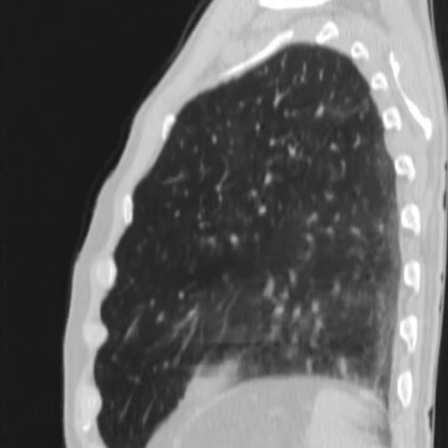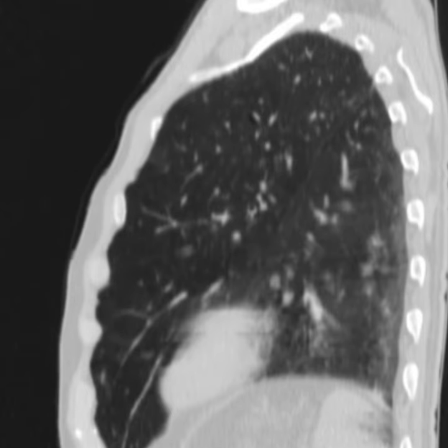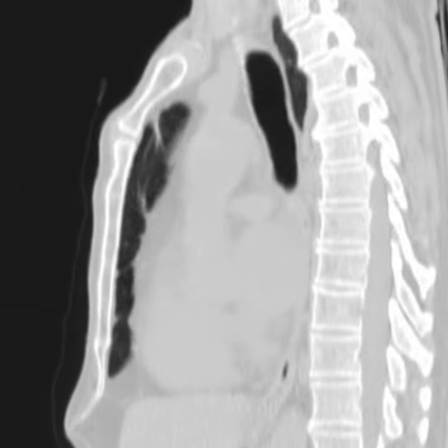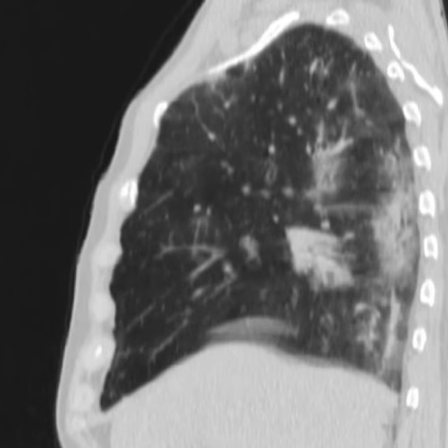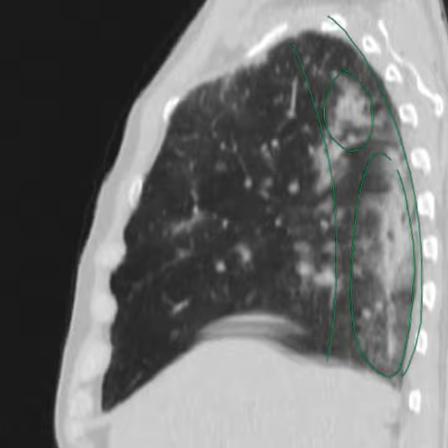So what do you mean by apico-basal gradient? Well, I mean, the abnormality should be less prominent at the apex, and as we go down, it should be more severe. But here, I'm not convinced that there is apico-basal gradient. Okay, what about here? Well, here we can see that the ground glass patches are present both superiorly and inferiorly, but there is no gradient. It's the same. It does not increase as we go down.